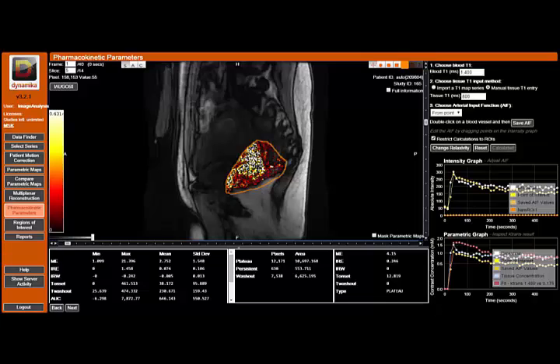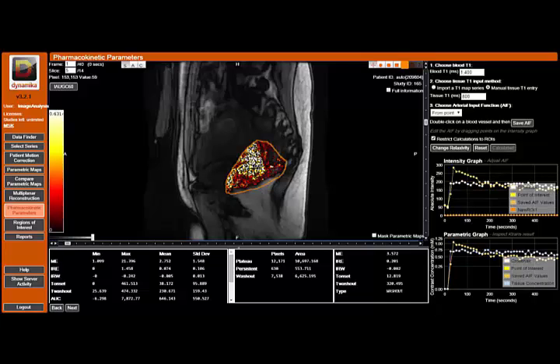In our experience and some of the work that we've been doing, it's really becoming apparent that the difficulties of the modelling and choosing which terms to include and which ones you could ignore actually point to the parametric calculations being just as good and much easier and faster to calculate and requiring less user input. As you've seen earlier, we have to do quite a lot of inputting of information here. Although we've set defaults as much as we possibly can to make it easy for you to use, you need to know if those default values in your particular case are valid for the images that you're looking at.